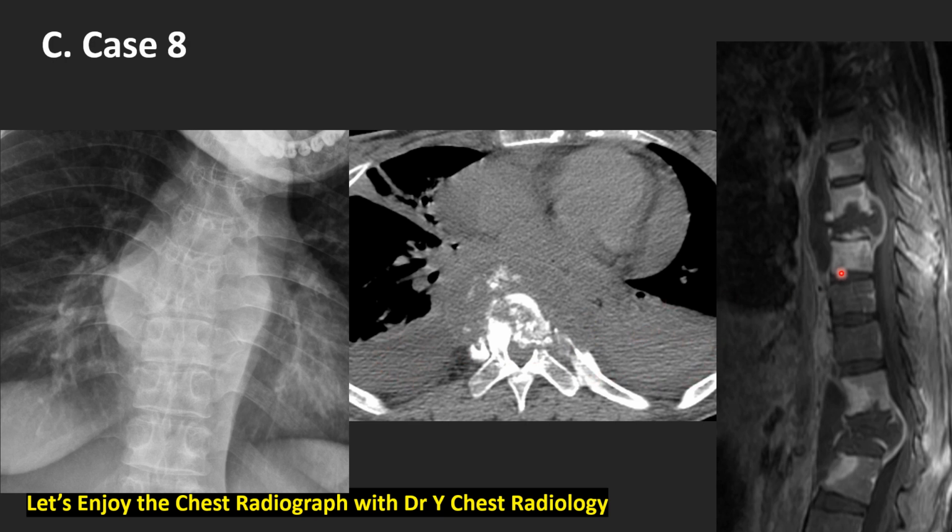And this is a sagittal dorsal-lumbar MRI showing what we have seen at this level. Yes, this is a cold abscess with enhancing rim. This is a cold abscess with enhancing rim. And she has another lesion in the lumbar area, lower lumbar. Yes, this is a cold abscess with enhancing rim. Cold abscess. Yes, TB spine. This is one of the paravertebral compartment lesions. Not easy to see anymore.